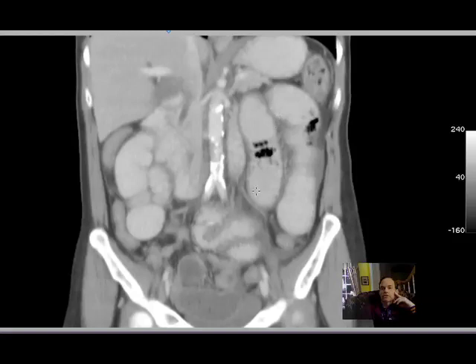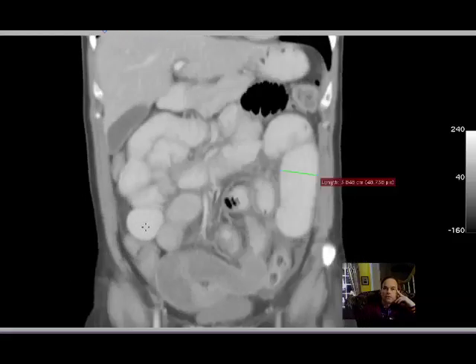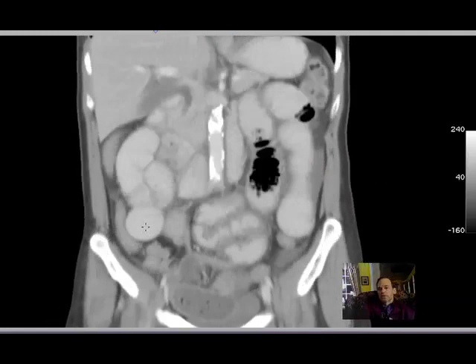This is jejunum. It has those folds and marks of jejunum. Some of these look like ileum, more distal small bowel without the clear markings of jejunum. But one of the nice findings is what they call a small bowel stool sign. Of course, normally you wouldn't have stool in the small bowel, but a stool-like appearance, flecks of solid material mixed with air, are the typical appearance of stool.